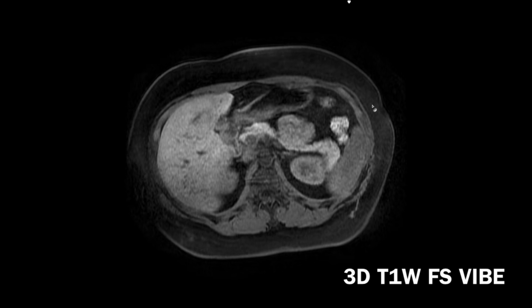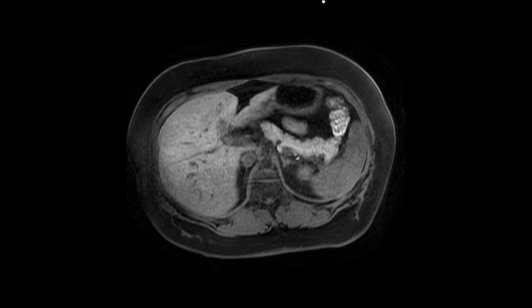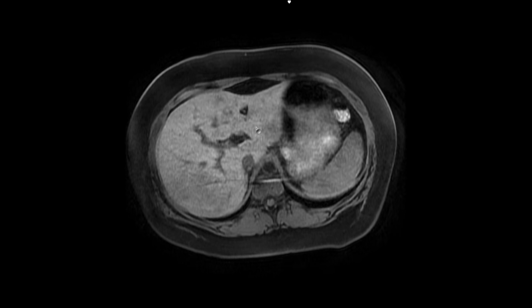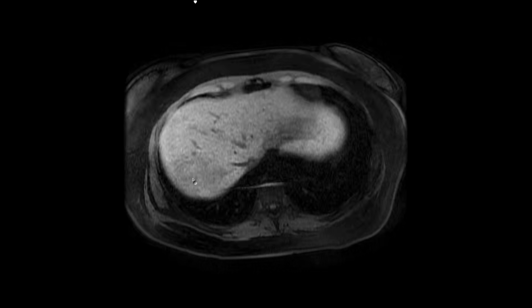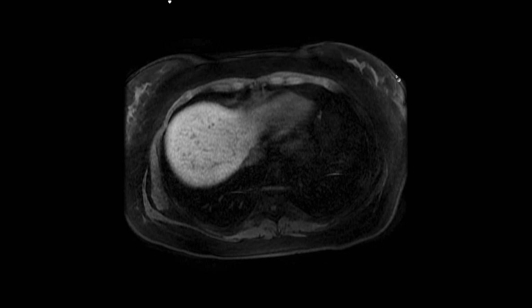If we look at our pre-contrast image, again, really nice pancreas. See how bright the pancreas is? Abnormalities would look dark in comparison. And we can see what our lesions look like here in the liver. Pre-contrast. And then we give contrast.